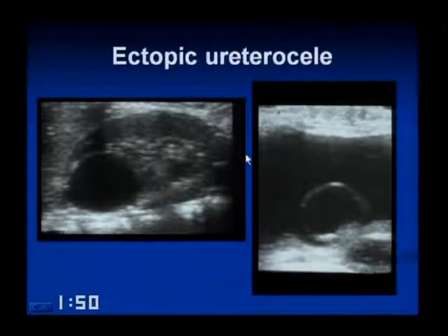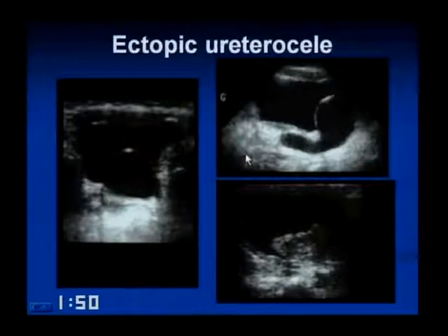These come in different flavors or varieties, and if you look at the image on the left, you can see that the ureterocele is very large. When they're quite large and they're located inferiorly, they can be called cecoureteroceles, and then those tend to obstruct the bladder. They can actually fall into the bladder neck with voiding, so they can be a very big problem.